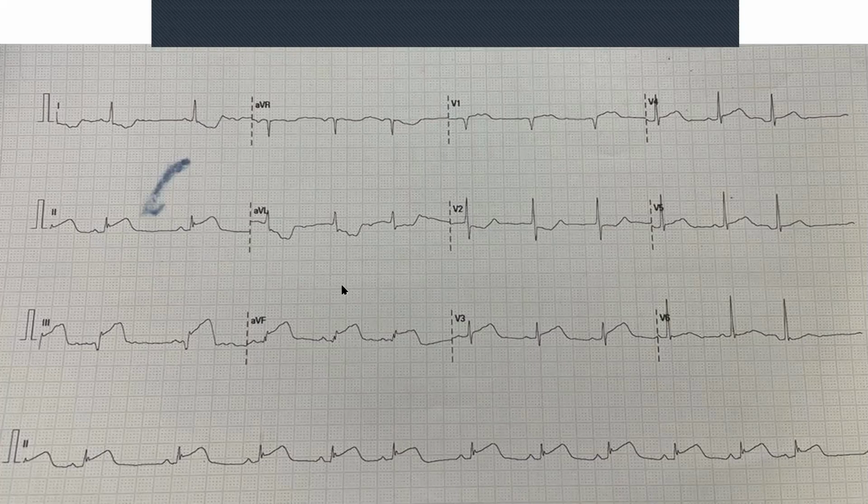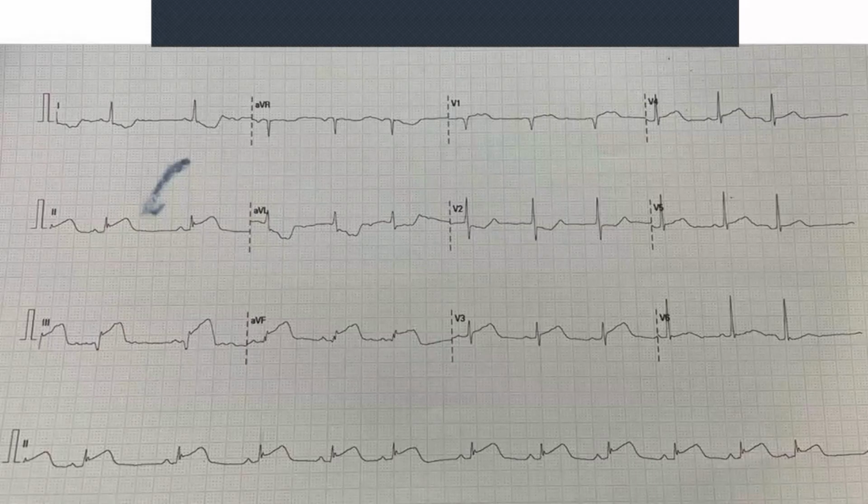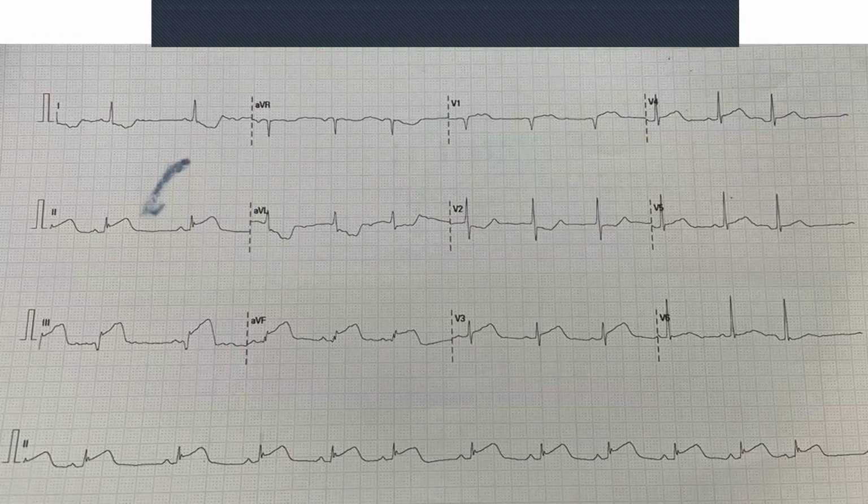Okay. Now, what happens is that just having ST elevations by themselves doesn't mean you've got an infarct. You've got to look for something we call reciprocal change. Right? We're going to go through the whole ECG. Reciprocal change, basically, what happens on one side should happen the opposite on the opposite side. To give you an example, if I push him away, he's moving away from me, but you should see him coming towards you. That's a reciprocal change, because you're seeing the opposite from the opposite side.